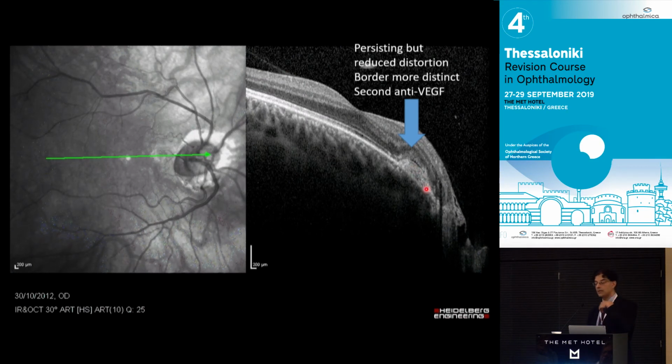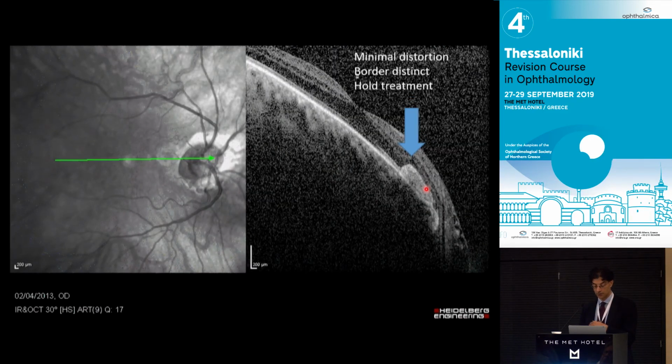And so in my clinic, we have Topcon on all the patients as they walk through the door, because that's quick and easy for the technicians to do. But for myopes, inflammatory membranes, genetic associated membranes, I get Spectralis on those because I can track it and look at the real subtle fuzziness, so I feel comfortable at the defined endpoint of stopping treatment. So that's the endpoint of stopping treatment there.